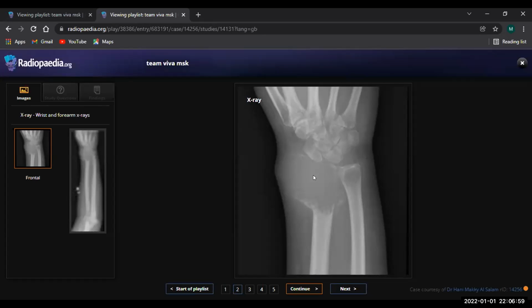In this patient, differentials include Ewing, eosinophilic granuloma, sorry, and a lytic lesion, giant cell tumor because it's subarticular and the age is appropriate. Bone cyst, but it looks more aggressive than just a simple bone cyst, and also the soft tissue component. So the most likely, I think it's a giant cell tumor.